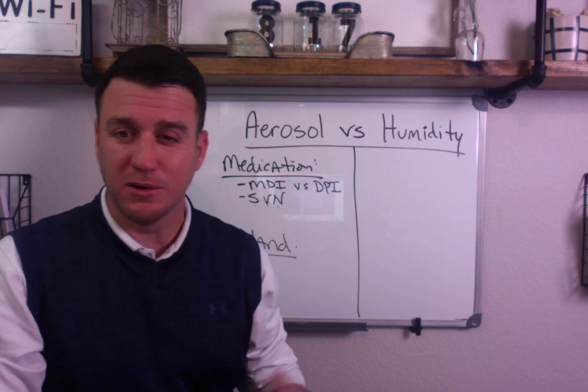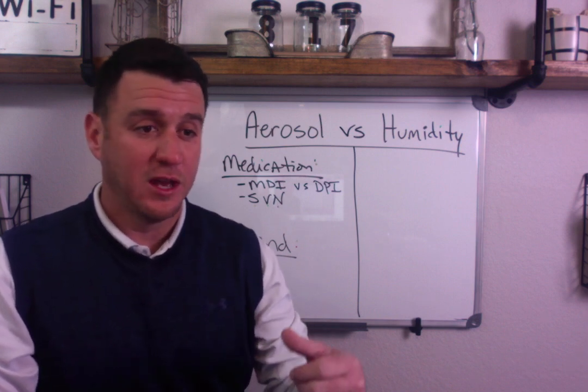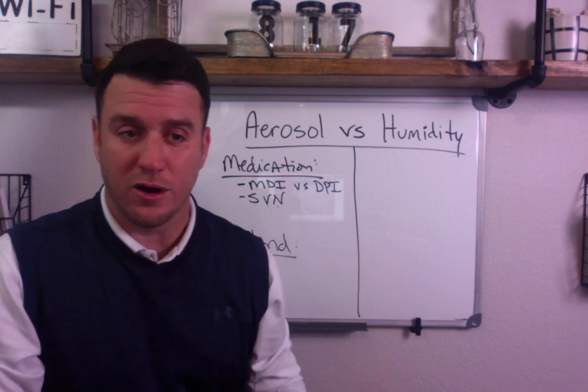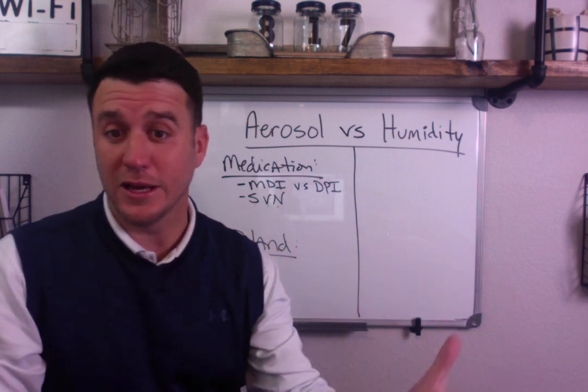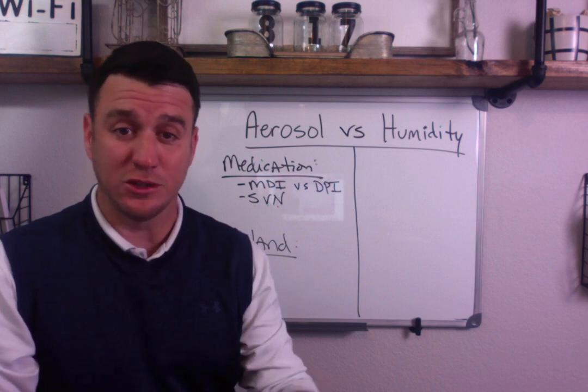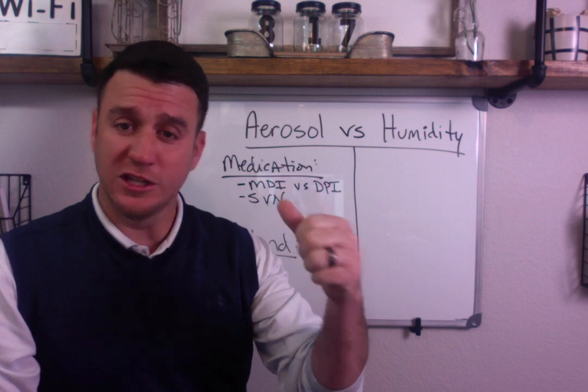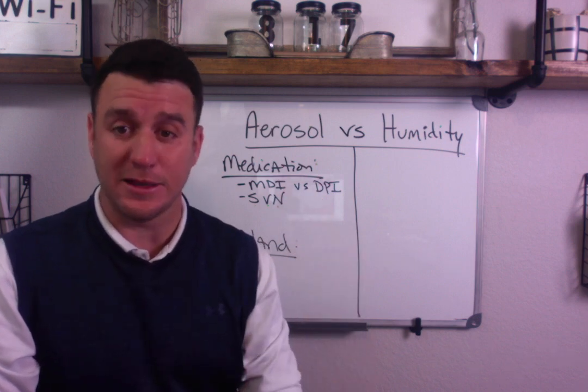Okay, so this is the most common device that we use when we talk about delivering, let's say, Q4-hour albuterol or Q6-hour DuoNeb, or any of our aqueous solutions that we deliver to our patients who are spontaneously breathing, not on a ventilator. We usually do this through a mouthpiece or a mask, okay?